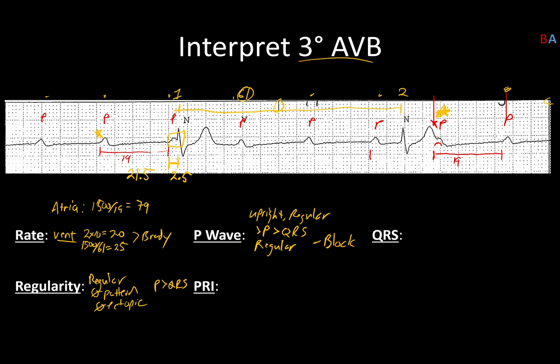Now, if I look at my second beat that I do have on the screen, we've got, probably say about right to here or so. And that gives me an 8, which is potentially real, but you've got either a massive one or one that's too short, followed by one that's still really long and not quite normal. And none of these really line up.